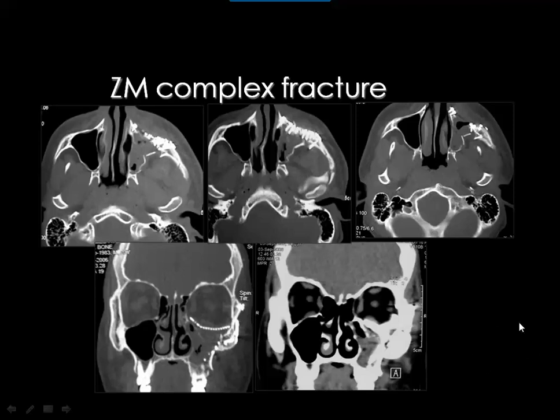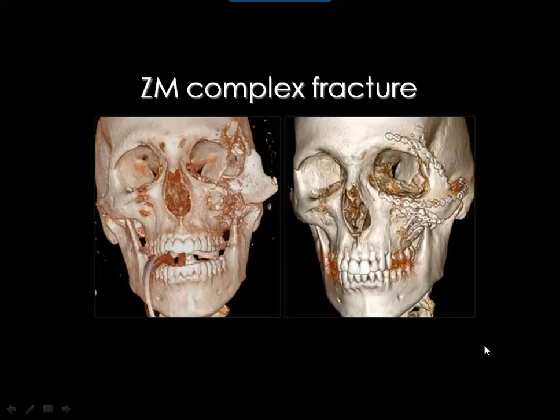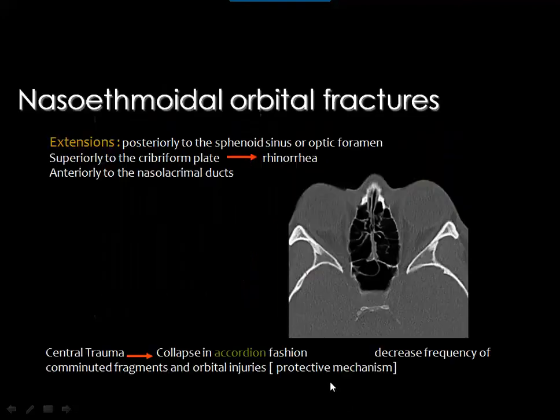Then, if you are confronted by a case like this, forget about these comminuted fractures. Forget about that the zygomatic arch is still fractured. All these are nonsense. You only concentrate on your report at the position of the zygoma and the sealing of the orbital floor. These are the very important issues. Then this is the fracture by 3D before surgery, and this is the reconstruction after surgery.